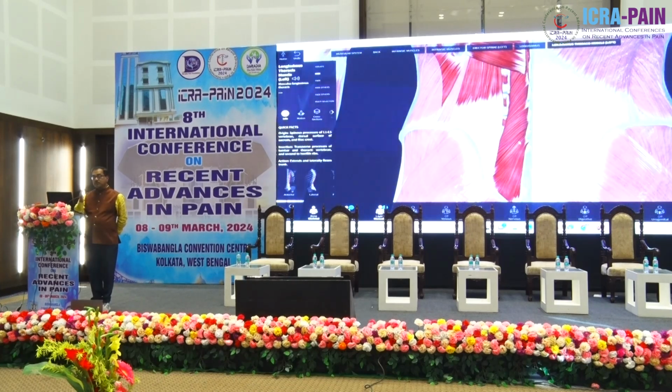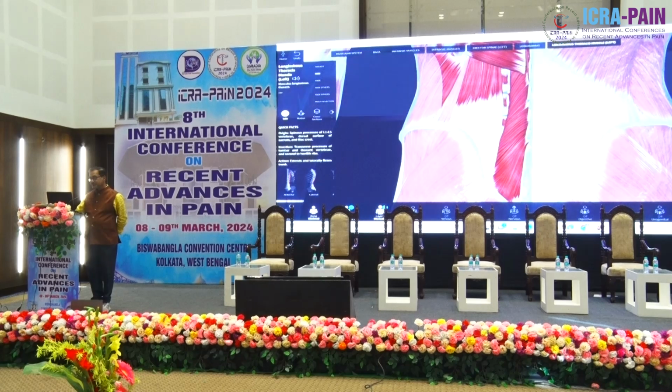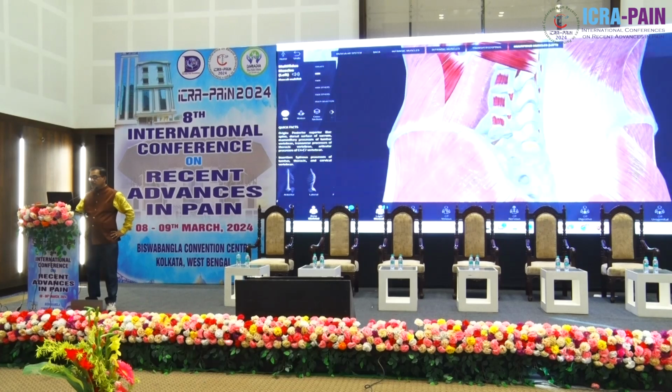And lateral to the longissimus, over the transverse process, what is that muscle? This muscle? Iliocostalis. This is iliocostalis. So let me remove this iliocostalis. Let me remove the multifidus. Then what comes? Then all the bones are exposed. So the lamina, transverse process. Here we can get 2 very thin muscles.